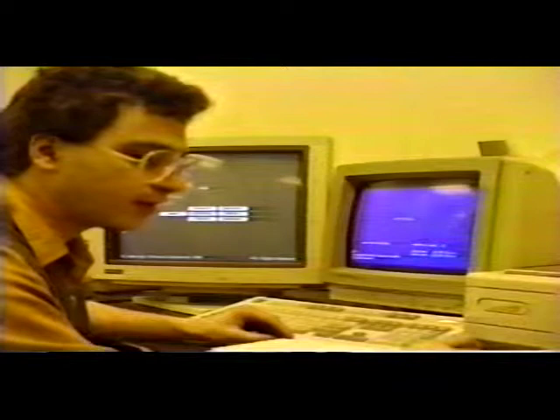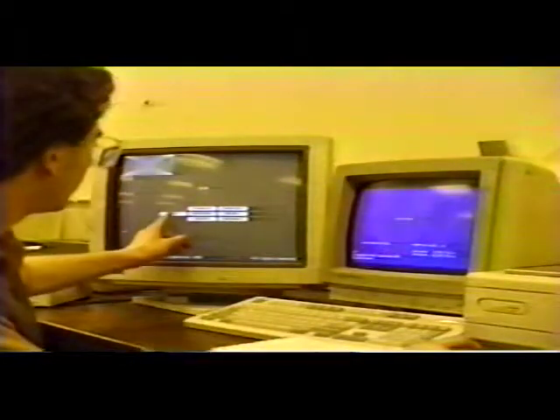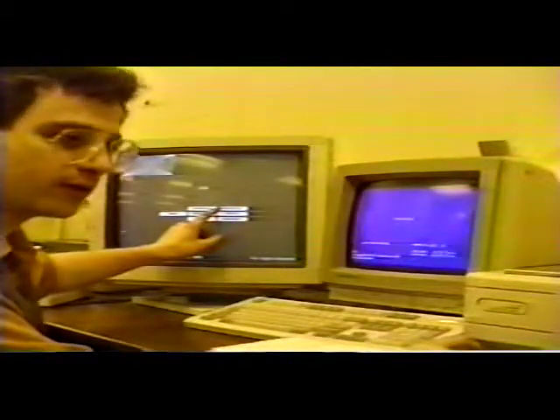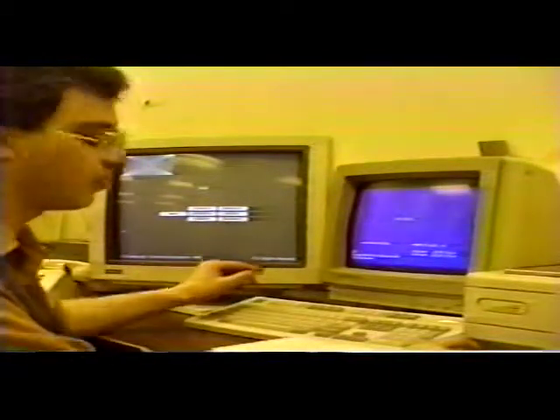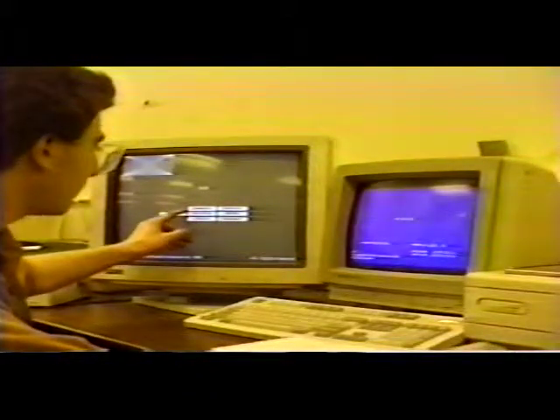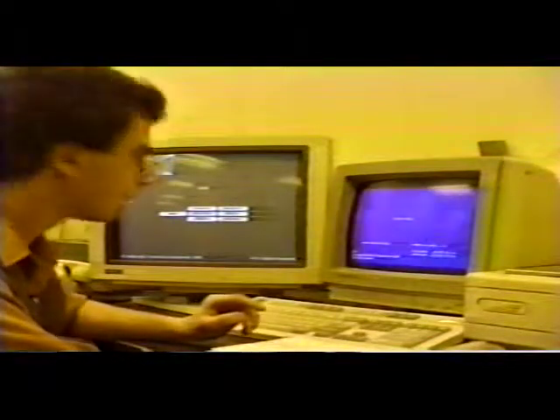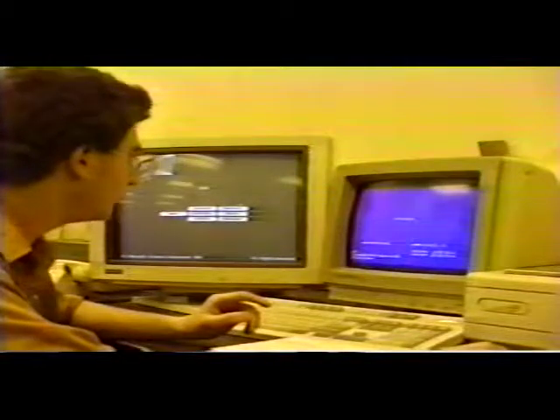When the disk is first inserted, the user gets a choice of 7 menu options. They can view the studies on the disk by modality, by date at which they've been entered, or they can simply view the most recent one. Other options here are for copying all the studies, copying some of the studies, or duplicating a card. Notice that when I move on to the buttons with the mouse, they light up.